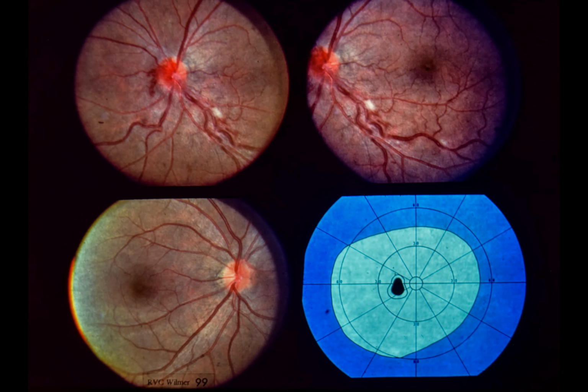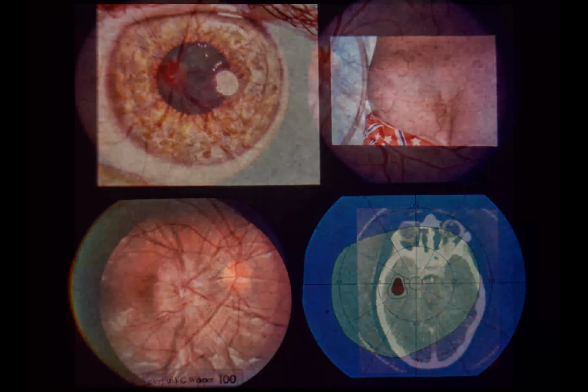Slide 99, Quiz 6. This patient has papillophlebitis. The fundus picture resembles a central retinal vein occlusion with dilated retinal veins, superficial hemorrhages, and cotton wool spots. The patient should have a general medical evaluation, including a complete blood count and a serum protein electrophoresis, to rule out such systemic diseases as hypertension, multiple myeloma, or Waldenstrom's macroglobulinemia. However, most patients with this condition are young and healthy and have no systemic abnormalities. The visual and ophthalmoscopic prognosis is excellent without treatment.